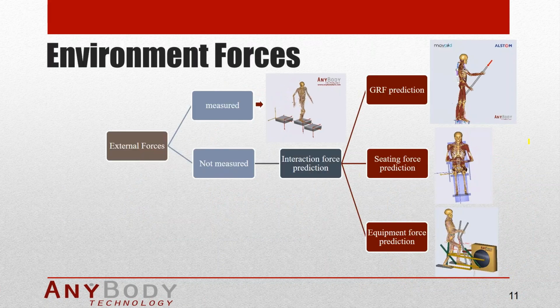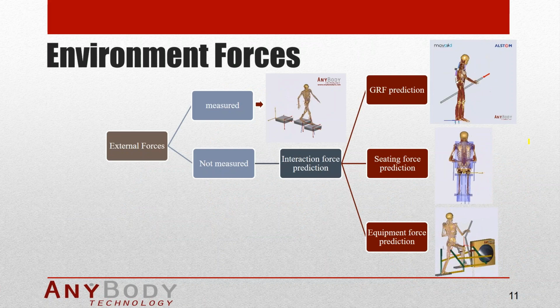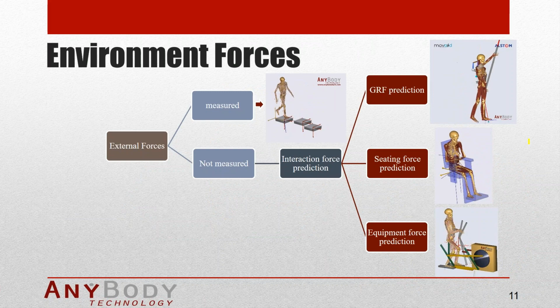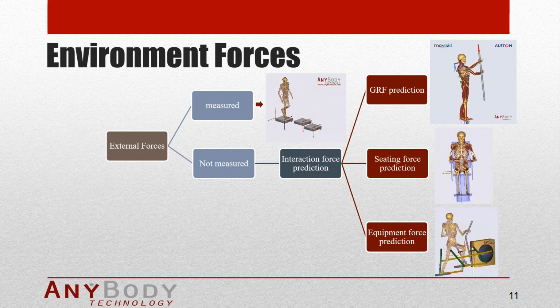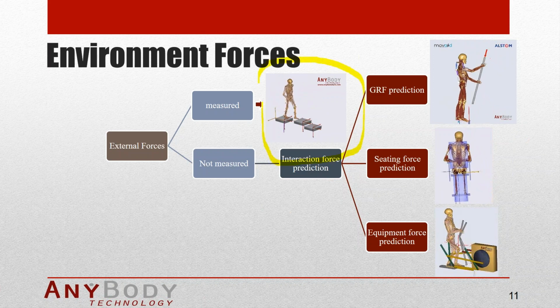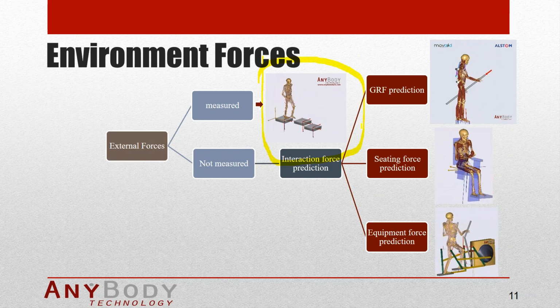So let's go to the next slide, and look at two scenarios for external forces. Because as Mohammed said, the analysis is inverse dynamics. So in principle, we put the external forces into the model, and then the model is going to predict the internal forces. And again, we have the good situation up here in the video at the top. I'm just going to highlight that here for you. And that's a situation where we have force platforms that are measuring the forces between the environment and the human body.